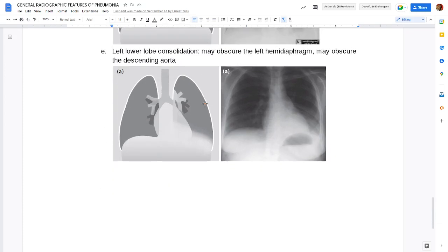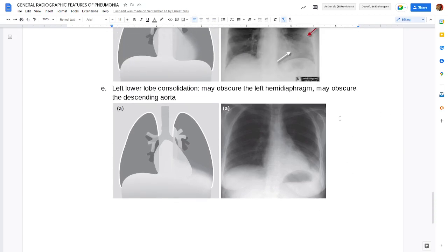And those are not the only borders. Even the diaphragm. I can explain even on that image. Look at the drawing, for demonstration of the normal. Look at the right lung.